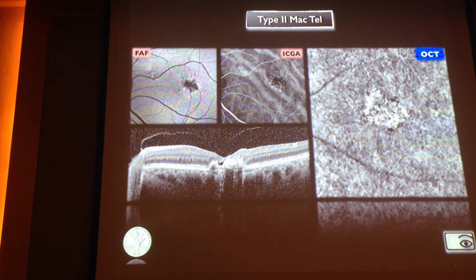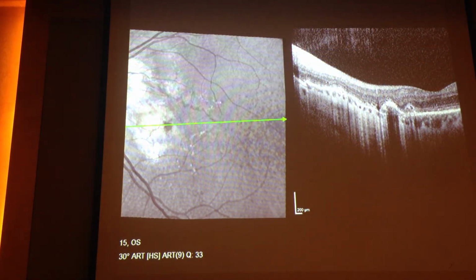If you take everything, all the layers, and you build a 3D, then you will probably be able to identify it. Otherwise, in these cases, the angiography, the stereo angiography, is working much better than angio OCTs. Angioid streaks.